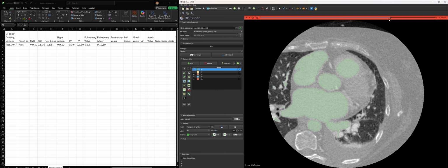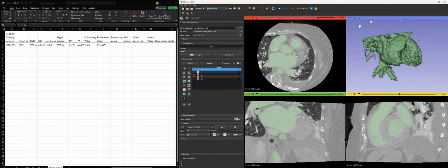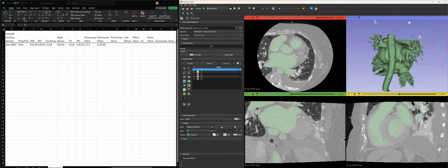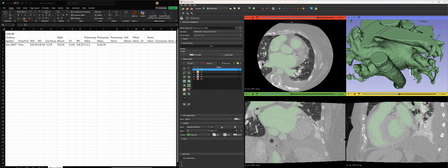Pulmonary veins. So now I'm looking at the veins, and I'm most concentrated on stuff out here. So like the proximal, if I can see, again, right? So I can see where all those veins are coming in.